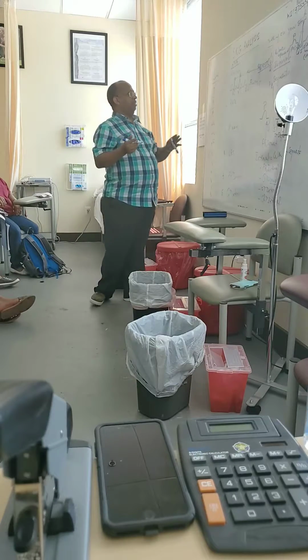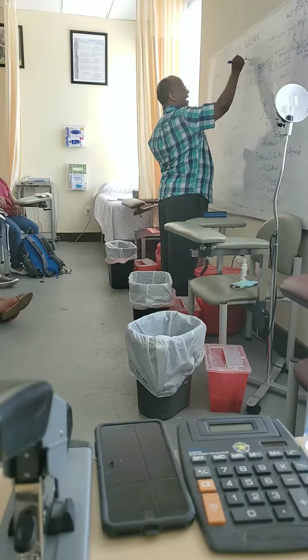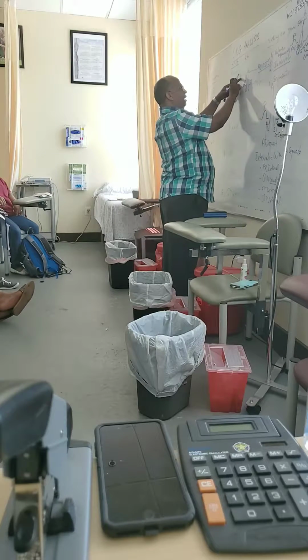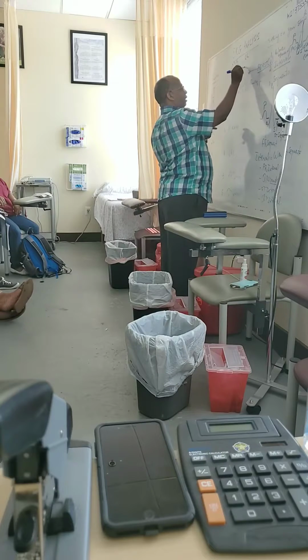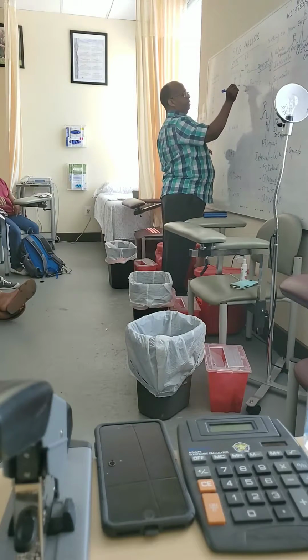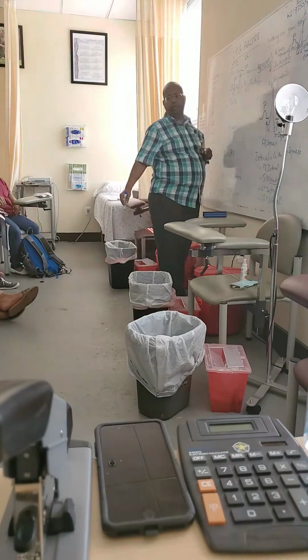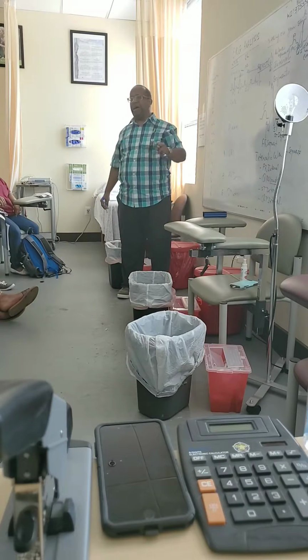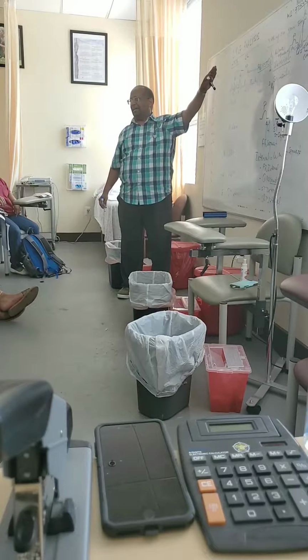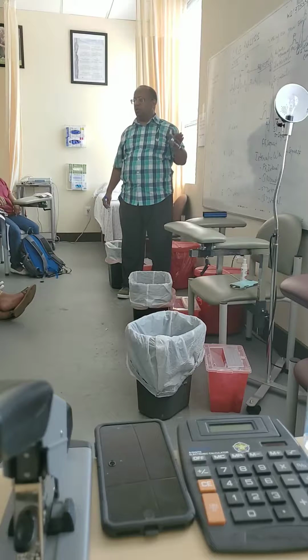If they have the same, we call it regular. So in this case, we usually check two rhythms. One is RR, between R and R. The other is PP, between P and P. Can you see, between this P and the next P? So we have two kinds of rhythms, RR and PP.